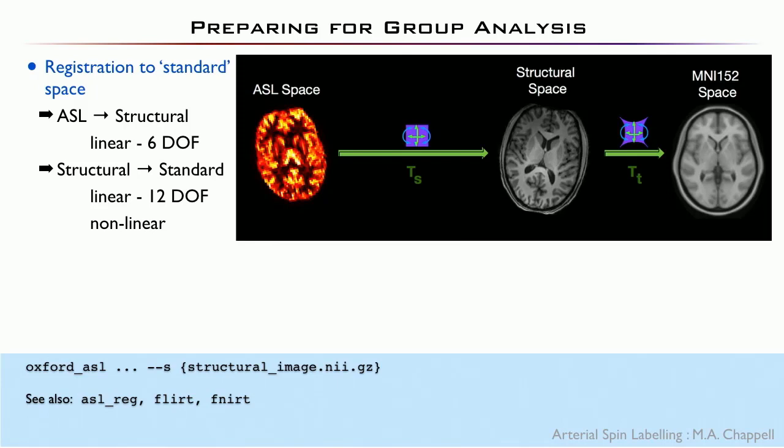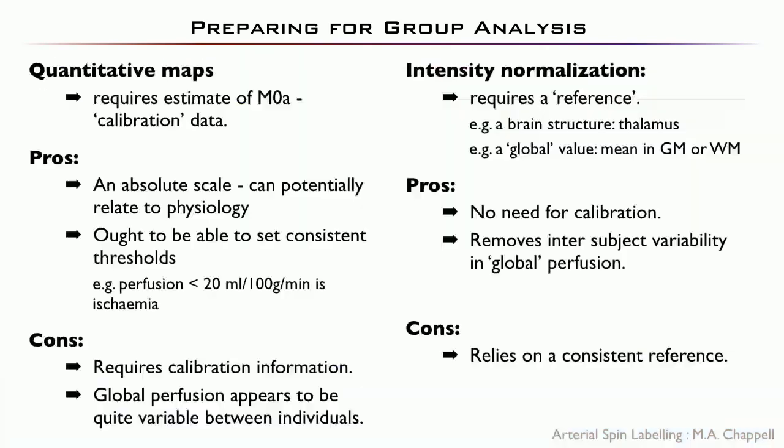Consistent geometry is just the classic registration process, and the caveat with ASL is that because you've got a relatively low resolution image and potentially limited SNR to start with, that first step of registering your perfusion image to your structural image, which you then use typically to get to your standard space or your template space, can be a challenge, but you can exploit the advantage that you get good grey matter, white matter contrast in perfusion images to do this process. And so we've done spatial normalization.